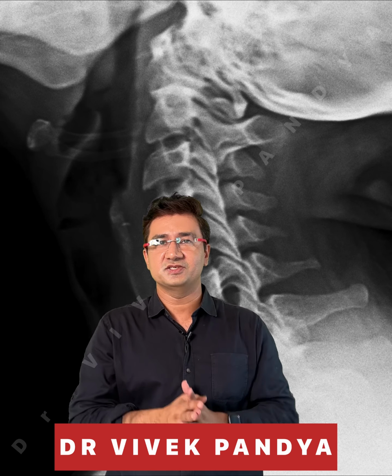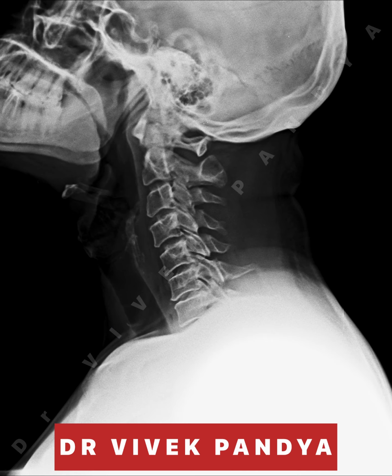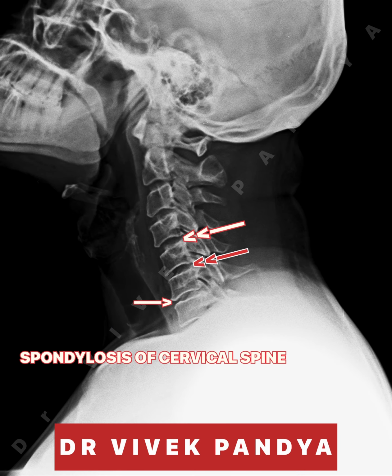Any changes of cervical spondylosis are best seen in a lateral view, as in this image you can see here, and in this image you can see the reduced disc spaces, straightening of the spine, end plate sclerosis, and the peridiscal osteophytes.